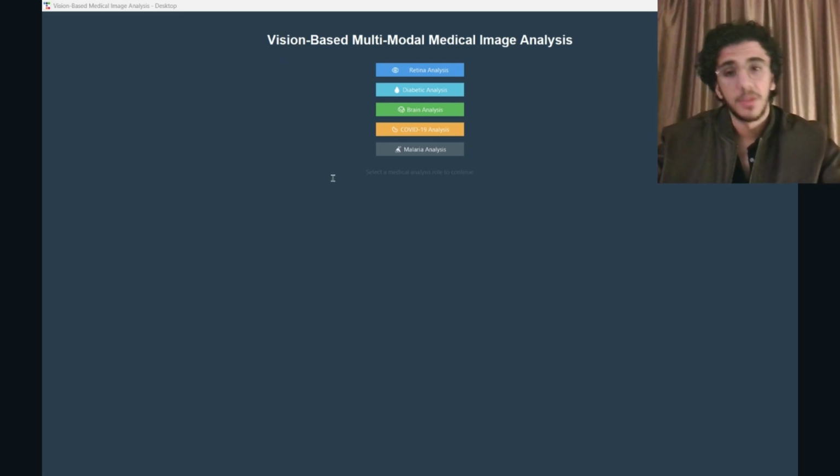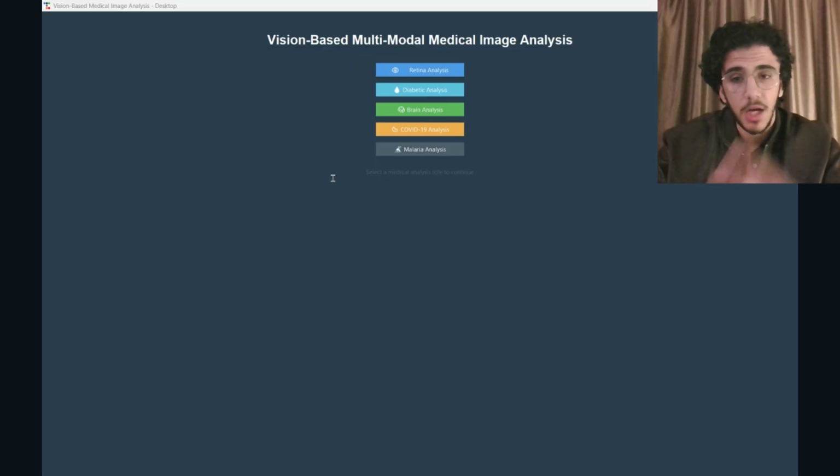Hello, I'm Abdelrahman Osama. I'm doing retinal disease detection using both traditional image processing and deep learning. I developed a desktop GUI where the user can upload images, analyze them, and compare methods. My contribution is building a hybrid system.